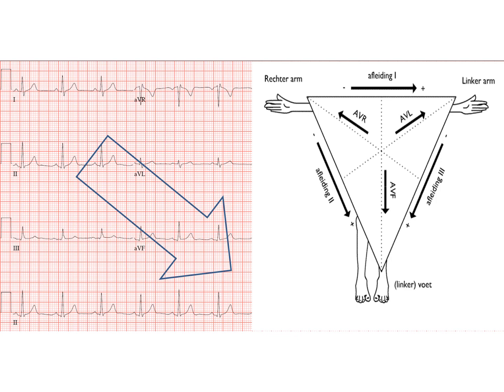So let's look at lead 3, and we will see that, in fact, it is mostly positive, but it is less positive than lead AVF, which is to be expected because lead AVF doesn't care about left versus right, but lead 3 is diminished by the fact that it wants the electricity to go rightwards, and in this case, the electricity is going towards the left.